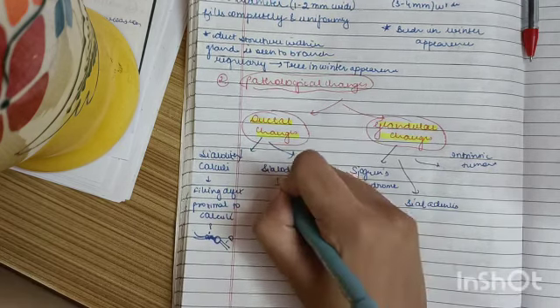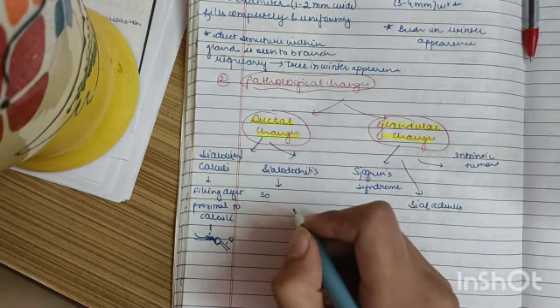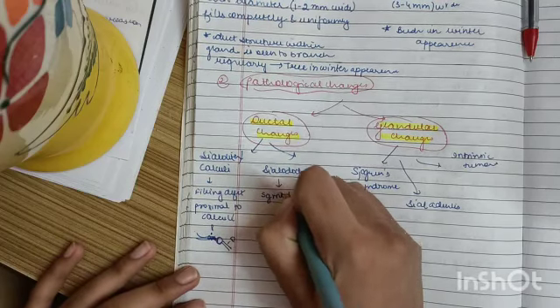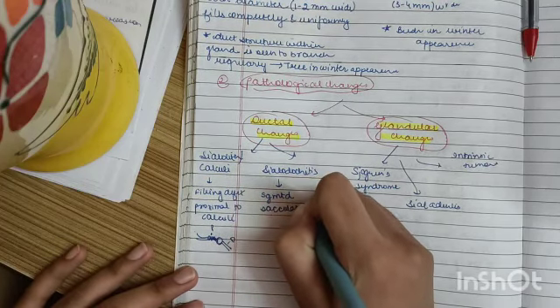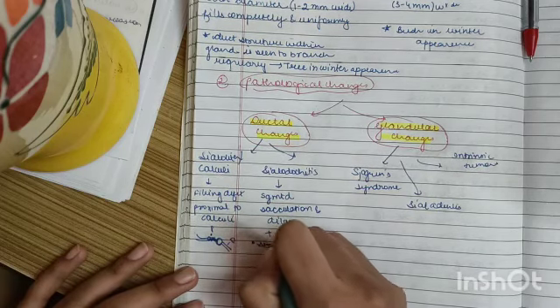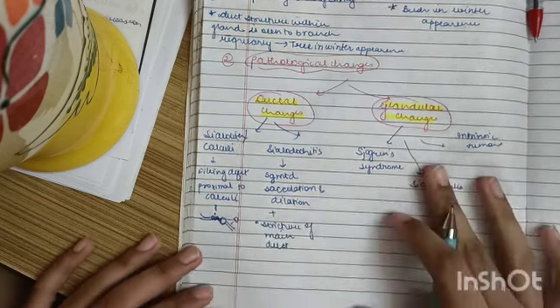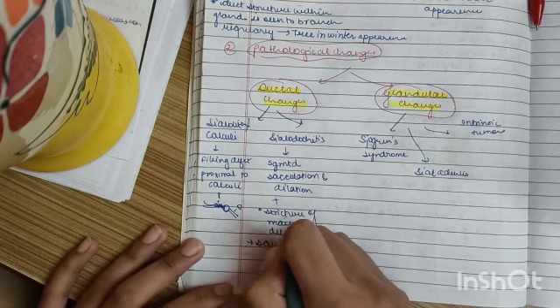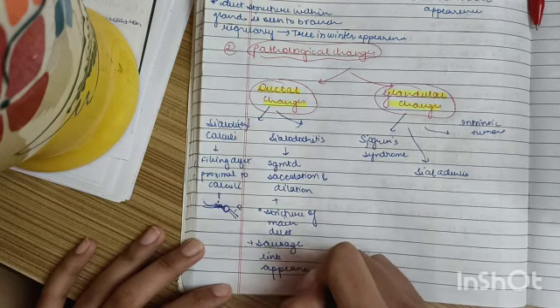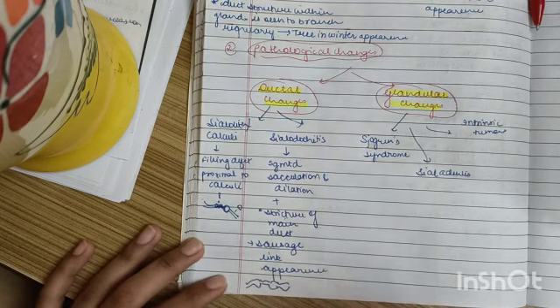In sialodochitis, you must remember that it is basically the inflammation of the ductal structures. What you will see is segmented sacculations and dilatation plus stricture of the main duct. Now the keyword here that you must remember is sausage link appearance. Over here, what you will see is a constriction and then dilatation, again constriction, then dilatation, just like a sausage.